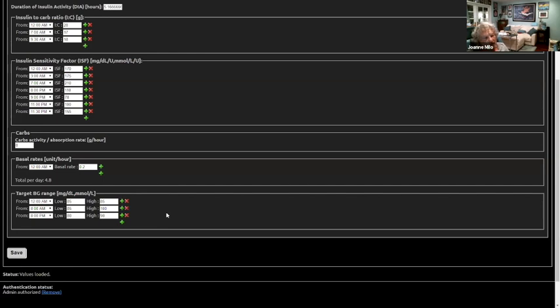Yeah, so that's a good question. So in Nightscout and in Xdrip and a few other tools, it might even be some of the OpenAPS systems, I don't know, but they use this idea that is carb activity over absorption rate.